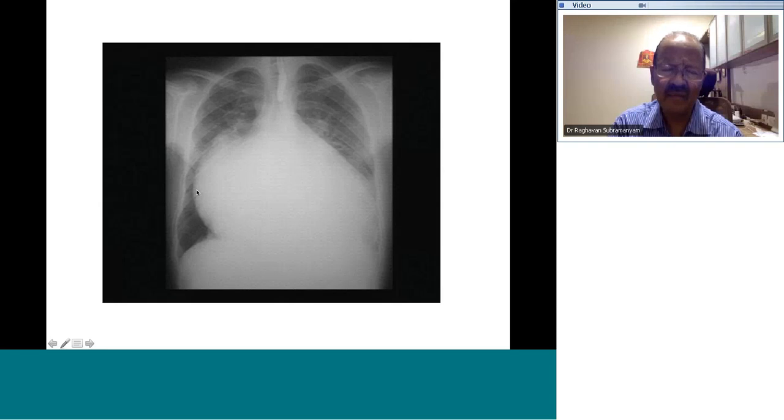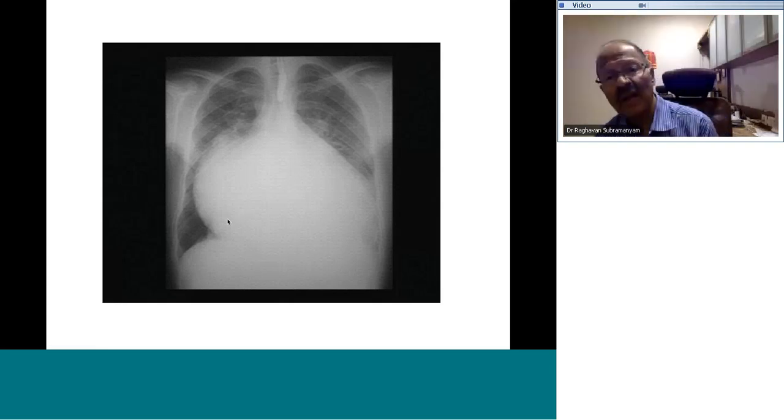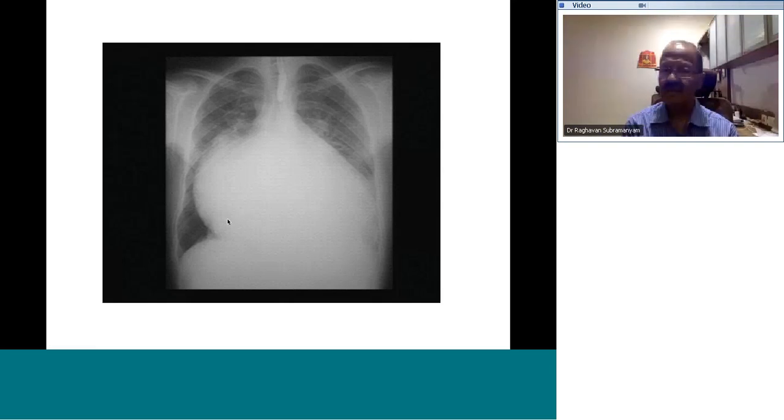Pericardial effusion has a money bag or leather bag appearance, sorry, leather bottle, leather bag appearance. You get a smooth line right from the superior mediastinum going down. You do not get these curvatures in the cardiac contour. You get one big sac right from the superior mediastinum up to the diaphragm. So this is right atrium and left atrium put together. This is not pericardial effusion. So this is massive cardiomegaly, cardiac failure, typically multi-chamber enlargement of cardiomyopathy, multivalvular heart disease, any of those conditions. Okay? Right.